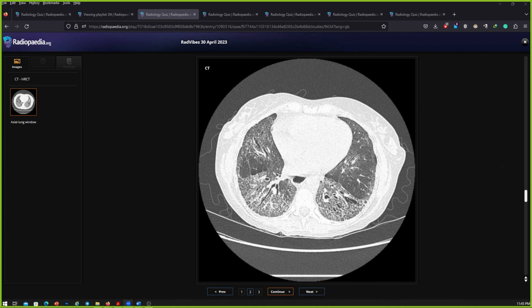Maybe some of these abbreviations we commonly use in our practice in India or in our particular countries, wherever you've joined from, but it is not necessary that the UK examiners might be using the same abbreviation. So avoid any abbreviations. Speak out the entire diagnosis, spell it out, talk it out. So non-specific interstitial pneumonia, and there is traction bronchiectasis.